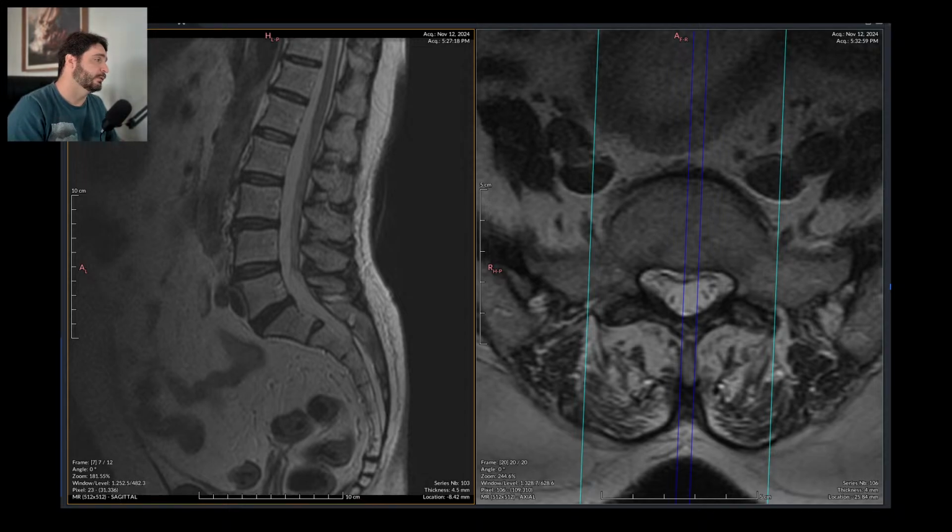Yes. The rest is fine. And we are done here. Why not? Just severe arthrosis and mild stenosis. Right there. We are done.